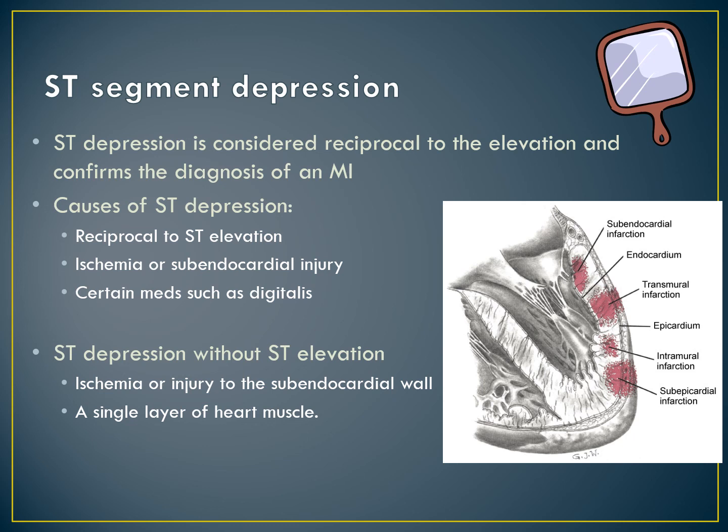If all you see is ST depression without the associated ST elevation, then this indicates hypoxia and may be quickly reversed with proper treatment.